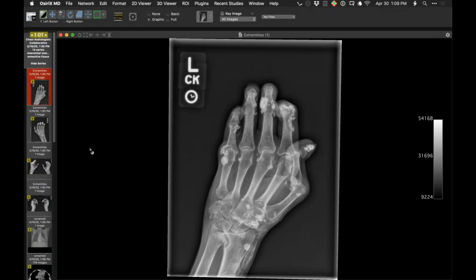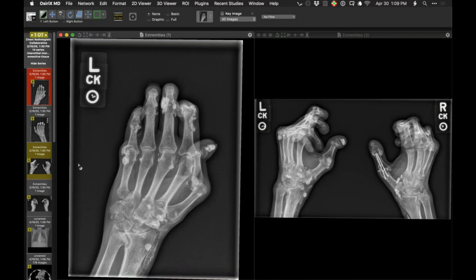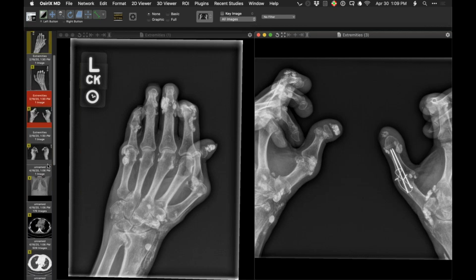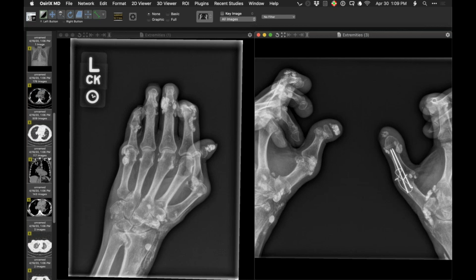So the imaging findings, and I'll show you a couple more projections, are those of both rheumatoid arthritis and, by virtue of acroosteolysis, in looking at the distal phalanges and the absence of some of them, and the calcinosis, very extensive, consistent with both rheumatoid arthritis and scleroderma, very florid. And I'm sure you've anticipated what I'm going to show in the chest.